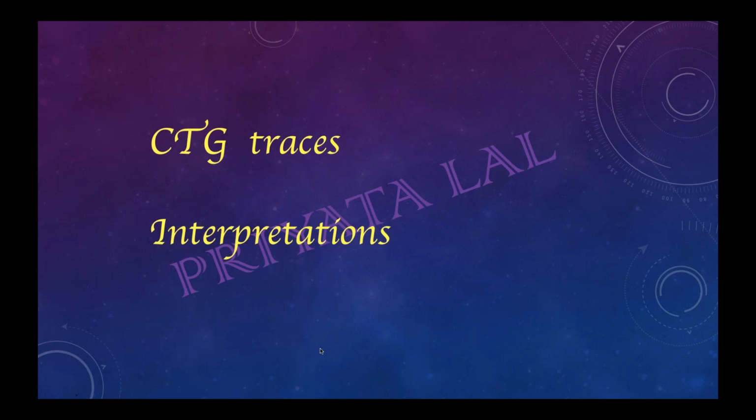This will be clear from the traces. Ma'am, excuse me. In features, we have 3 columns: one is the heart rate, another is the variability, and the third is the decelerations. So to declare it as non-reassuring, should all 3 be there, or can each individual be counted as one?